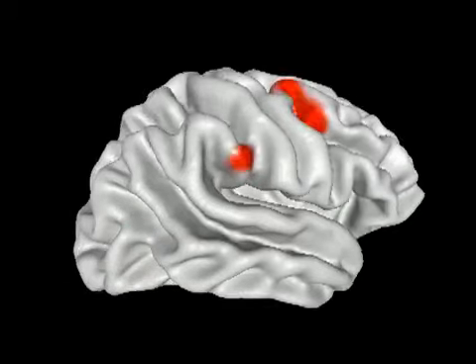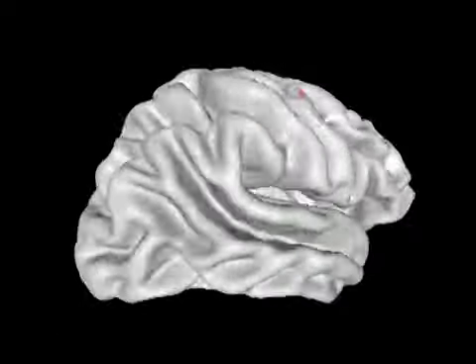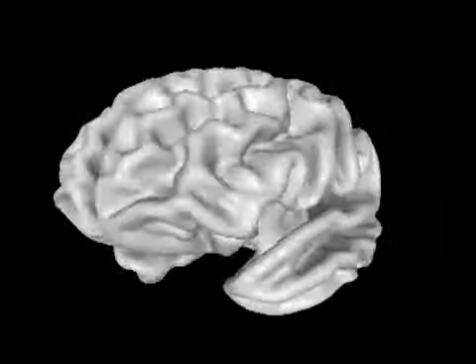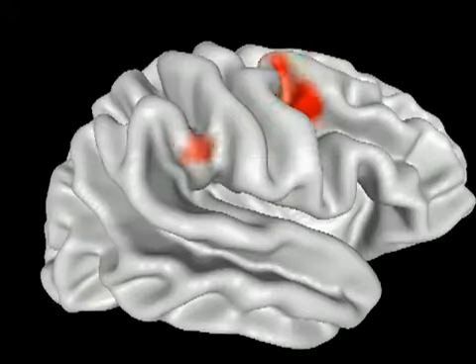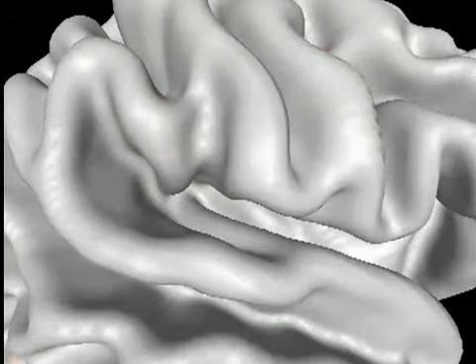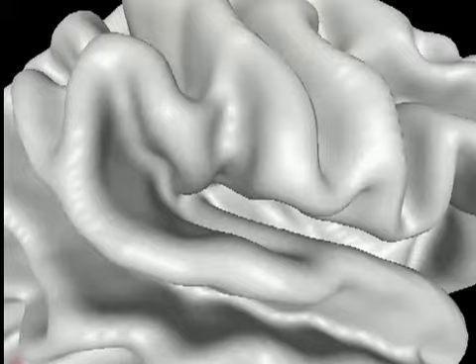We can rotate the brain and see that actually there is very little activity that's deviant from normal in the left hemisphere, which is not an injured part of the brain. And we can zoom in if we wish to examine more details of the deviation from normal in terms of the gyri and sulci of the brain. We can zoom back out.